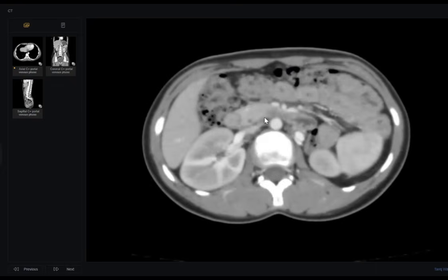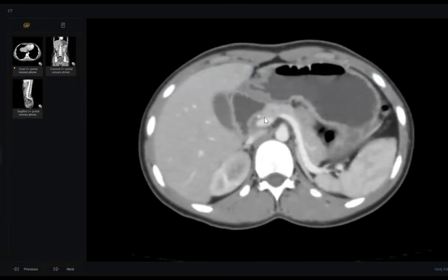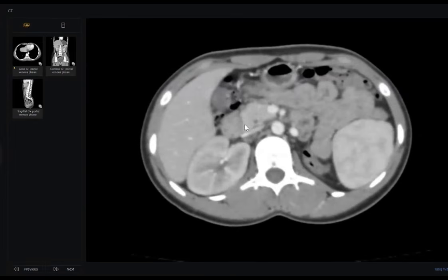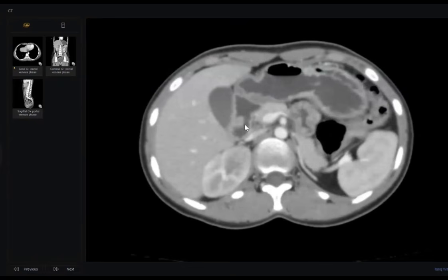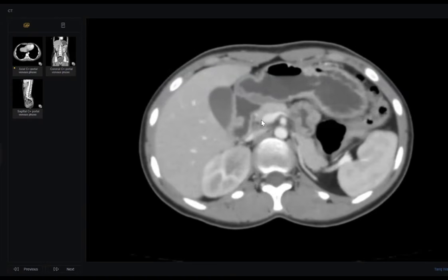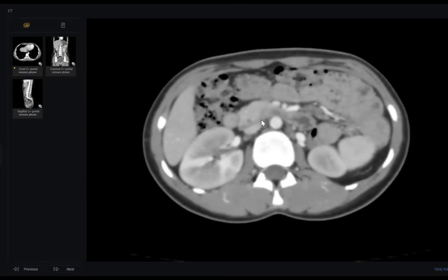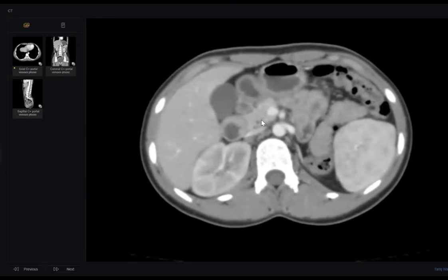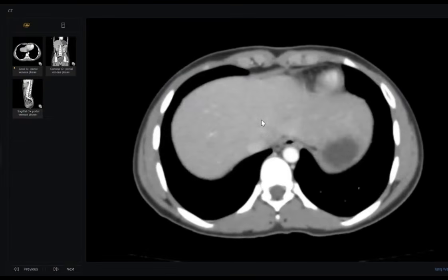Other parts of the pancreas are the anterior head, neck, body, and tail. This is the dorsal bud. Very important: in dorsal agenesis, you can't find the tail, neck, body, and the anterior part of the head of the pancreas. Complications are chronic pancreatitis and obstruction, duodenal and stomach obstruction. So this patient has nausea, vomiting, something like this.